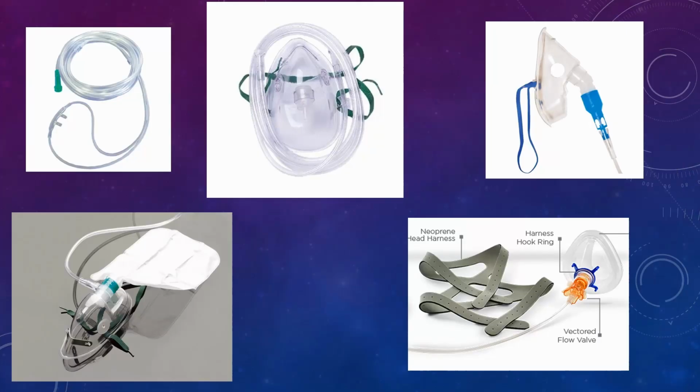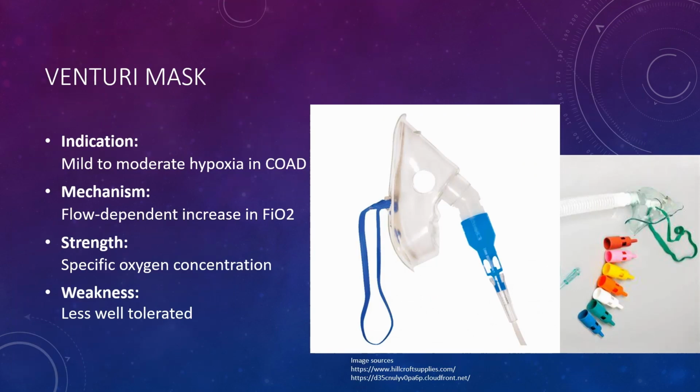The important consideration here is the need for a fixed level of inspired FiO2 in COAD. Only the Venturi face mask out of all our devices so far is able to do this. Depending on the selected barrel, which is the colored device attached to the end of the mask, a fixed or set FiO2 level can be delivered to the patient. The different colored barrels are each able to deliver a different level of FiO2 selected based on the patient requirements.